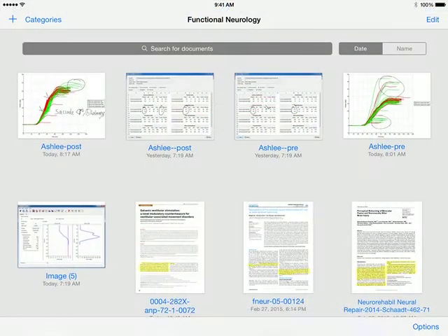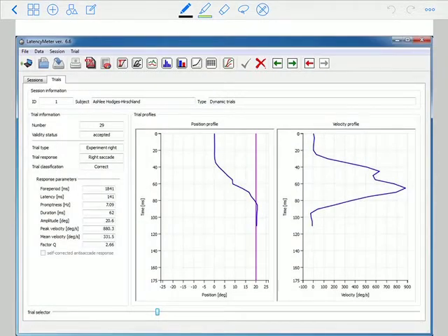Okay, so let's take a look at the individual trial I was going to show you as a sample. It becomes much more clear. I always recommend that you look at the individual trials. Reason one is because I find that the saccadimeters are rejecting perfectly legitimate saccades, so I like to go in and make sure I check them off to be included in the sample. But you can see here in this young female patient's case, there's the hitch between 5 and 10, just short of 10 degrees, and there comes the intrusion.